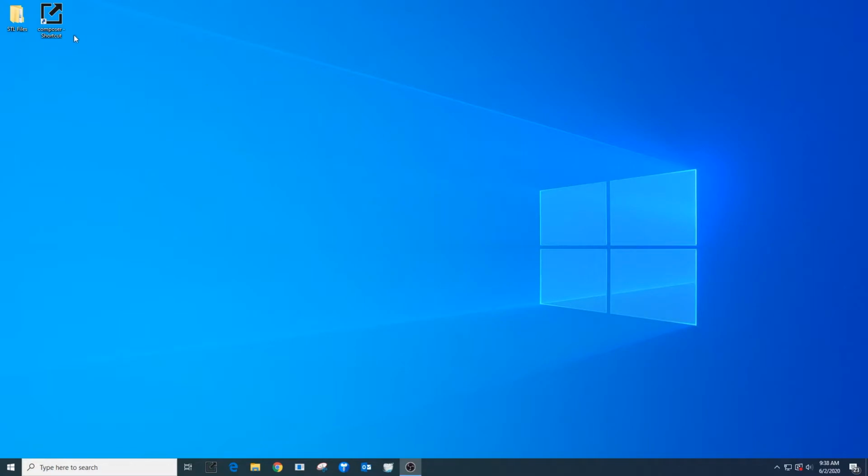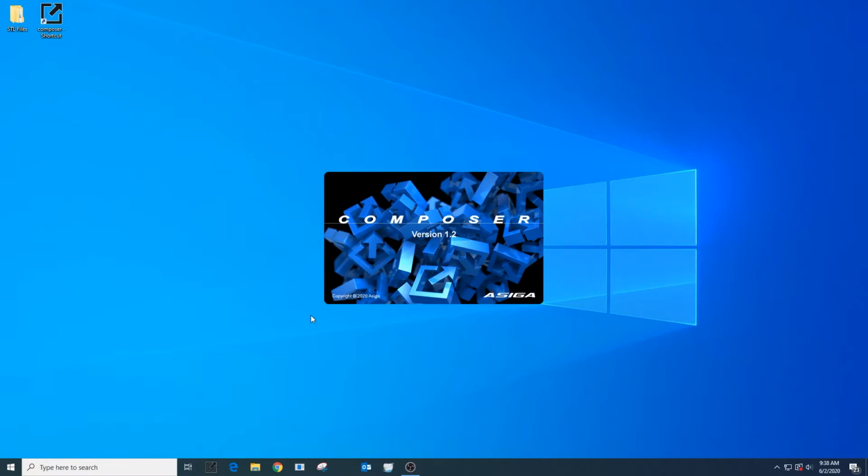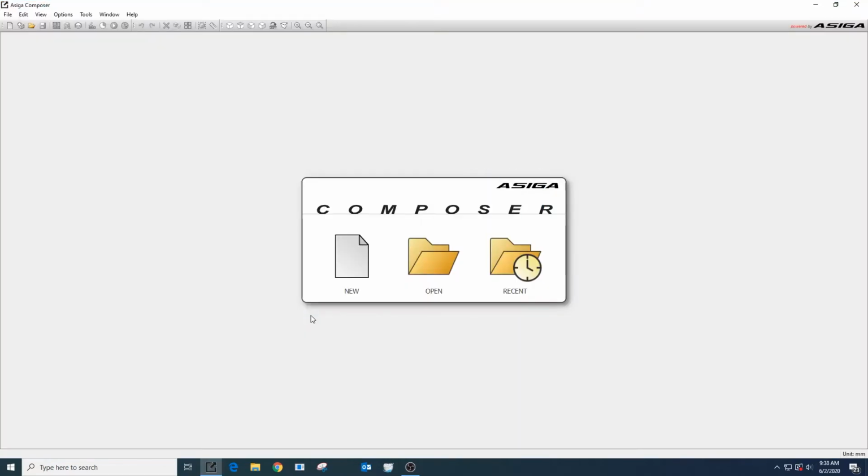In this video, I'm going to show you how to use the Asiga Composer software to import an STL file, nest it, support it, and send it to the printer. So to begin, I'm going to open up the Asiga Composer software, and I'm going to create a new build.